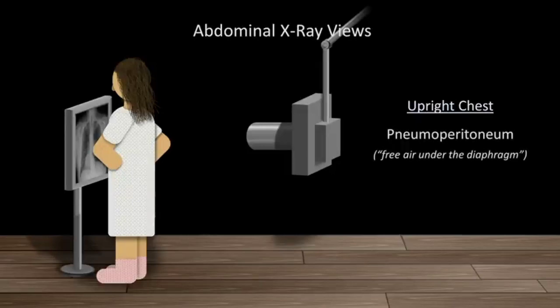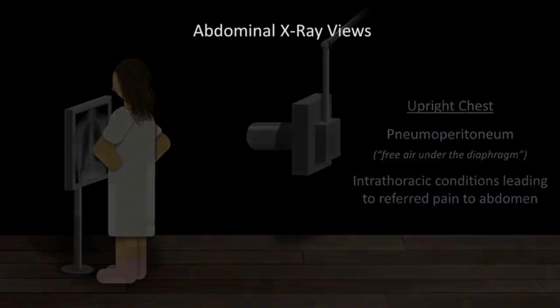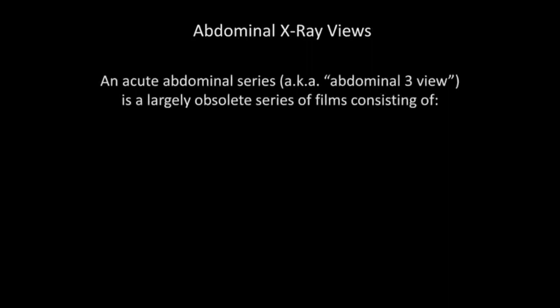As I mentioned, there are really only a couple basic things that you need to know, and we're going to keep it simple. The first thing that you need to know when looking at an abdominal x-ray is how the patient is positioned. The main views are upright, supine, which means the patient is lying down and facing upwards, and decubitus, which usually refers to a lateral decubitus, aka the patient is lying down on their side. The second thing that you need to know is that air rises. So, if you're looking for free air, you need to take these two things into account to know where to look. Think about how the patient is positioned and know that air rises.